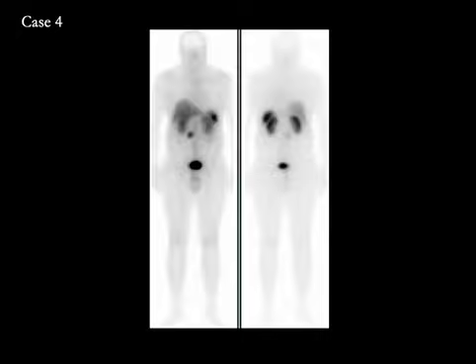Case number 4 shows a patient who presented with a history of a paraganglioma. Paragangliomas are extraadrenal pheochromocytomas. These are also of neuroendocrine origin, and they can be evaluated by using indium 111 octreotide. The whole body images in anterior and posterior projection shows an anteriorly located focus in the right paramedian mid-abdomen. There is faint uptake in the anterior abdominal wall, and this is at the site of the prior surgical resection of a paraganglioma, and focal uptake here suggests that there is recurrence of the paraganglioma.